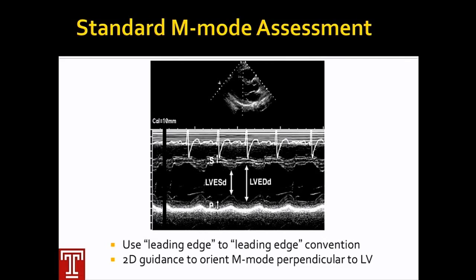So this is actually an oblique M mode. Even though this is a textbook from many, many years ago, probably just as 2D was coming out, I found it rather telling that even this illustration shows some of the problems with M-mode measuring, because if you're not completely on axis, you're going to be oblique, and you really have to pay attention to that.